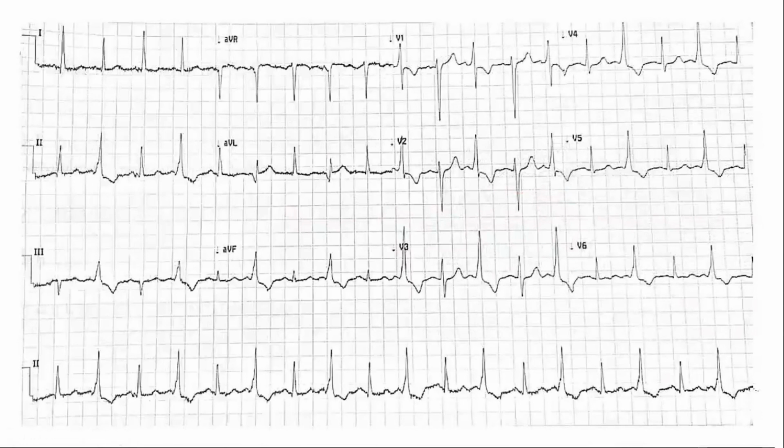Okay, now this is the next case. It's a very interesting case. I've shown you previous ECGs, but now look at this ECG. If you remember that ECG, we'll discuss that. Just have a look at this ECG and then we can discuss what's happening.